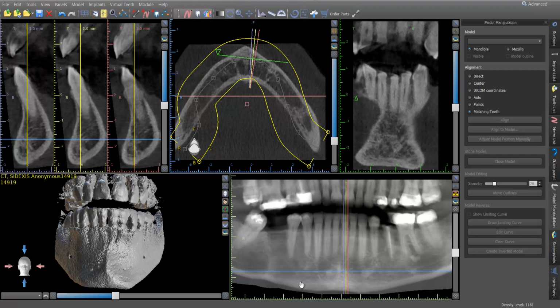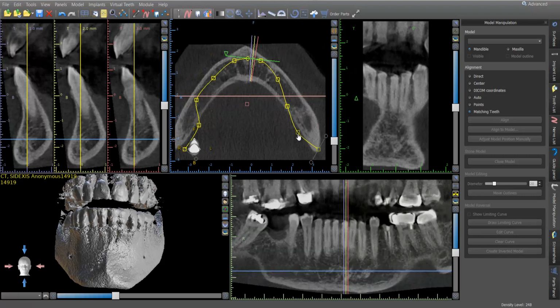Okay? And then last is the pan view. If you notice, it is actually a collection of everything viewed between these yellow lines up here. And if I click this line right here, or this button, it shows me only what is viewed within this yellow line, this single slice of the pan. Okay? So beyond that, we talked about the panels over here.